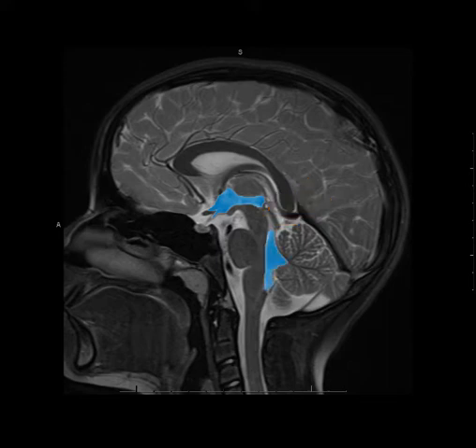The exit foramen that you can see on the midline sagittal image is through the inferior aspect of the fourth ventricle, called the foramen of Magendie, or Magendie if you're an American, and the lateral outlets that you cannot see on the midline sagittal image are the foramina of Luschka.